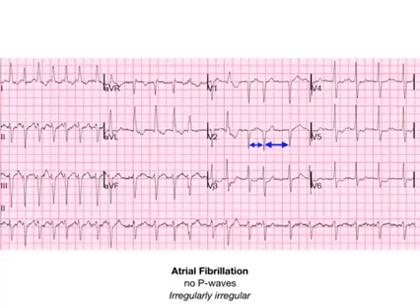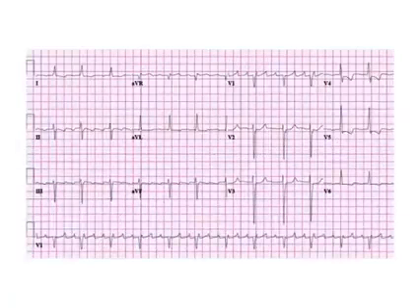Okay, so this is AFib, very, very high yield because they can get into pharmacology, they can talk about rate control, they can talk about rhythm control, they can talk about hemodynamic changes and pathophysiology, but you have to be able to recognize an irregularly irregular ECG with no P waves. So again, rate, rhythm, axis, that doesn't get you anywhere. The question is, are there P waves and is this sinus? In this case, the answer is no. And then you would look at this ECG after seeing that it's not sinus, which eliminates a million things that it could possibly be, and you'd see that irregularly irregular QRS interval, and you'd say, it's AFib, I'm done, I got the point, and I'm moving on. That is atrial fibrillation.